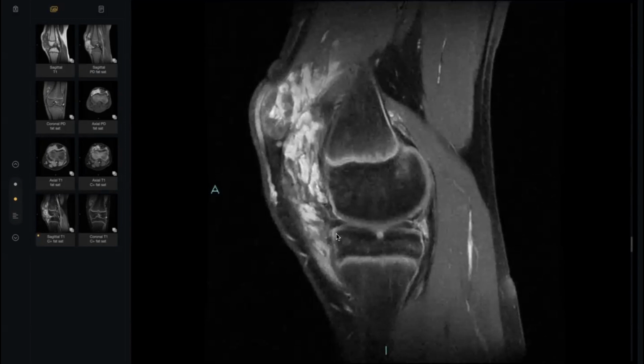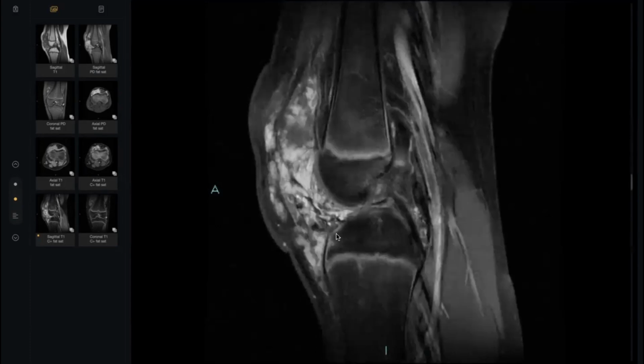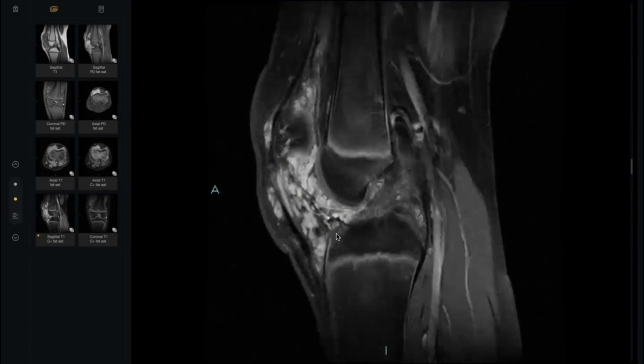This is post contrast. So the lesion is enhancing, with hypointense foci. This is the same foci that you see in the X-ray. So they are calcific, enhancing lesions, a lesion bright in T2 with calcification.